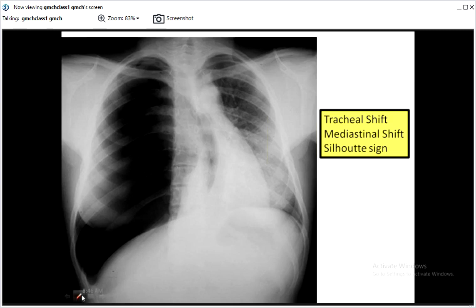Okay, again this is a deep sulcus sign. You see where it is, this costophrenic angle, and where this is, and this has been widened and pushed downwards. So this right hemithorax is black, and the mediastinum or the heart or the cardiac silhouette, is it maintained? It is not maintained. It has been pushed to the opposite side. Okay, so you can see trachea to the opposite side, cardiac silhouette to the opposite side, expansion with radiolucency on the right side. So this is a right-sided pneumothorax.